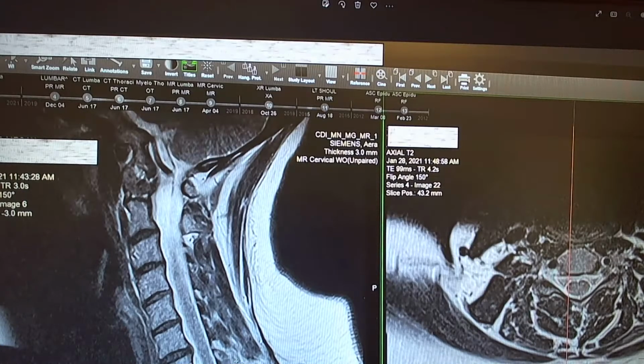Now, you don't see much here. Now, you see that MRI, and then you see something here. That seemed almost like a little destructive tissue there. We talked about it last time. If you see it in the C1, C2 area, in the dens area, it could be a tumor, but in this case, it is not. Especially in this area, if you see a lot of tissue that bulges out, we call that pannus.